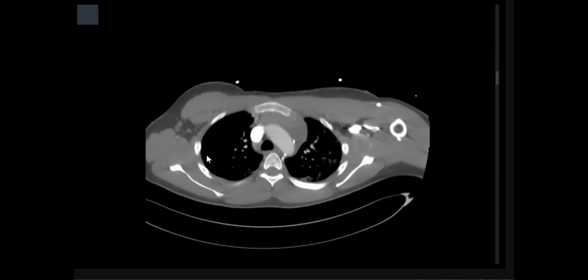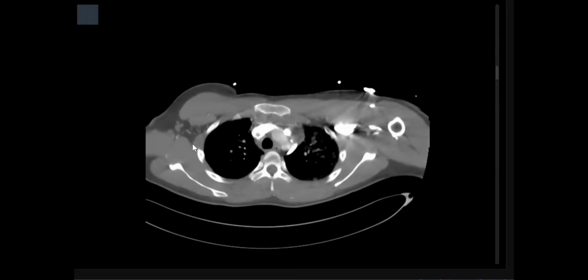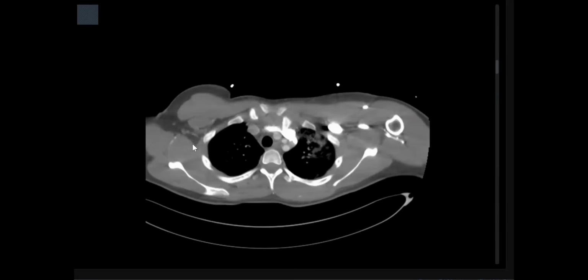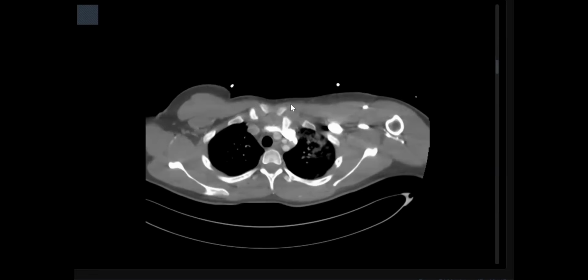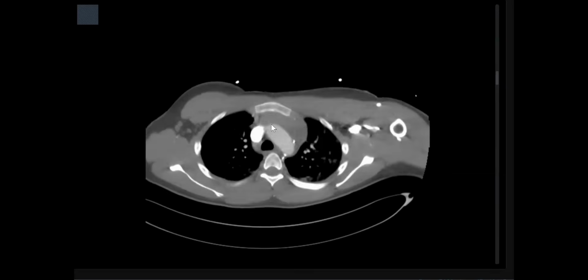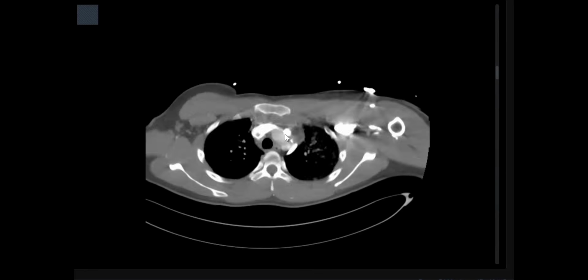So whenever the examiner gives you a bone window, please assess the bones. This is very important, my friend. So the mediastinal hematoma here is likely of venous origin, secondary to posterior dislocation of the sternoclavicular joint. Again, it's vascular and orthopedic surgery as well for correction.